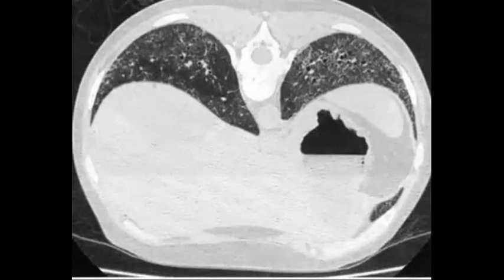Sarcoidosis, maybe, but you need to have the typical appearance of sarcoidosis, an even distribution of nodules, which is not in this case. Maybe non-specific interstitial pneumonia, but again, there is subpleural sparing and the interstitial changes are a bit far from this case, but you can put it in the differential diagnosis.